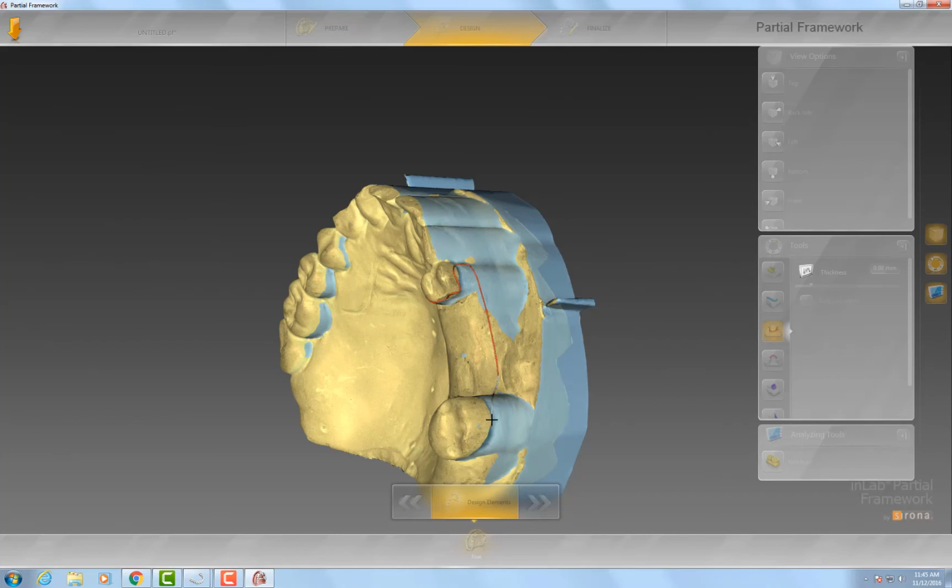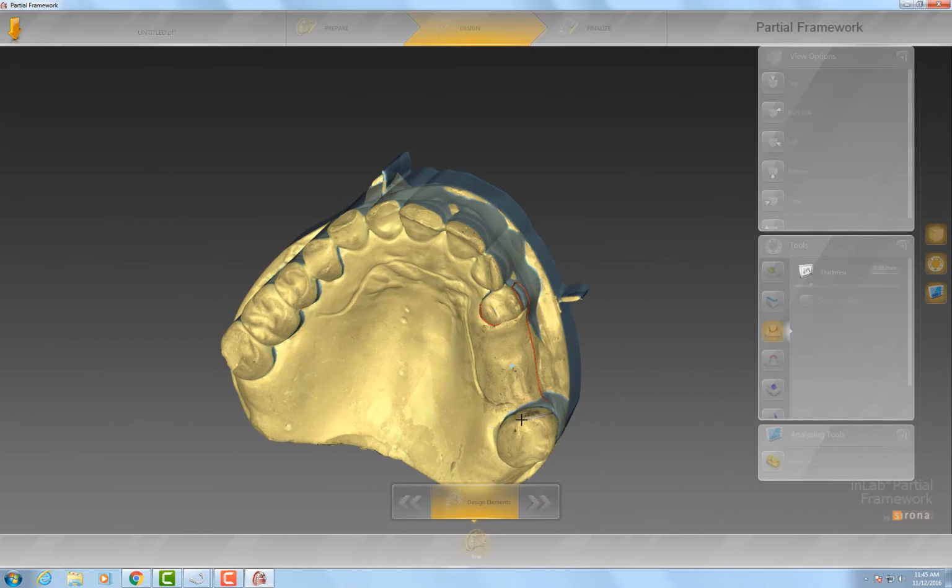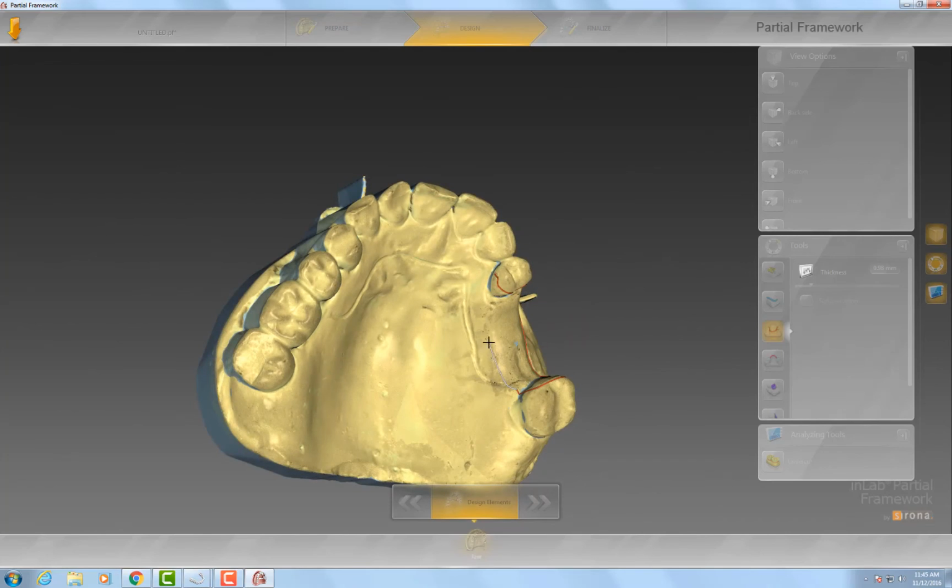And keep in mind, these are all mucosal supported, so that's actually where they get a lot of their stuff. Great. So it looks like this one worked. Got a nice little set for Valplast in there. Maybe extend it a little bit more.